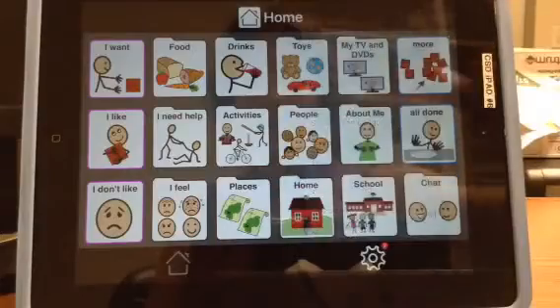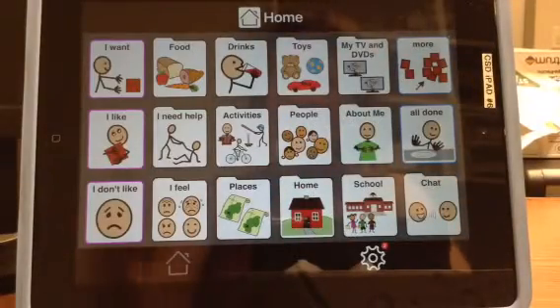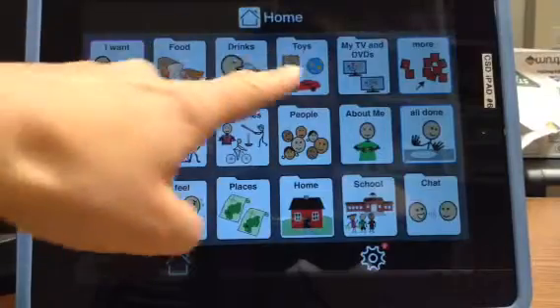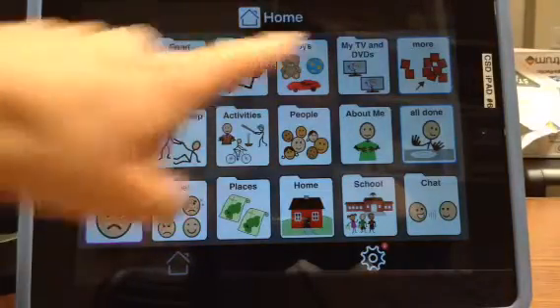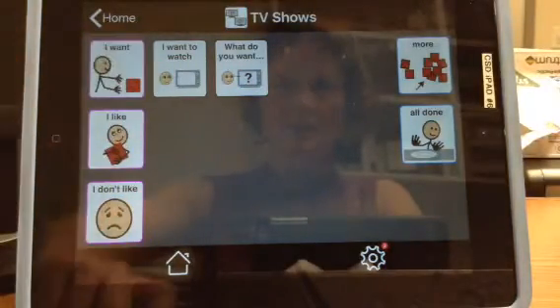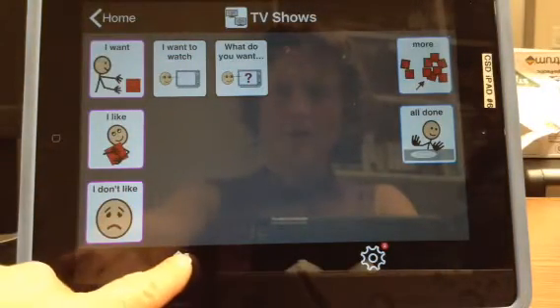All right. So now, if I navigate away from the home page, for example, how's it going? I want. Good. And back to the home button.